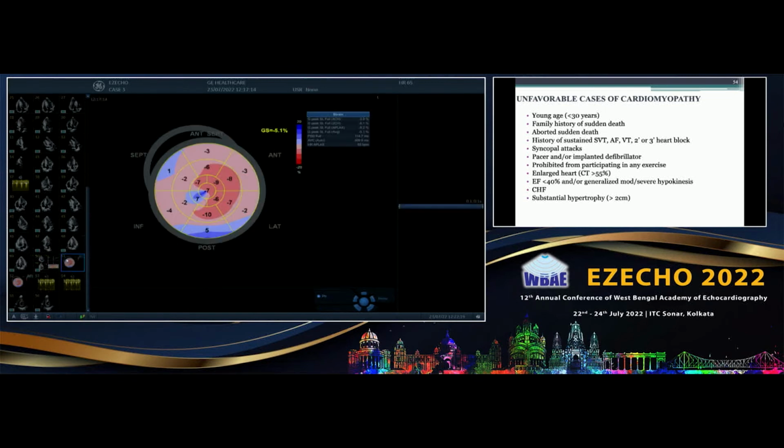Yeah. Now, you know that the septum was the most hypertrophied thing, and it has got some areas of blue, okay, and some areas of very low strain here. This can happen, that means this hypertrophy is pathological. This is because of the disarray. Some part of the septum is actually lengthening, because those areas are the interstitial fibrosis, replacement fibrosis, which are actually lengthening. So this is very important, and the hypertrophied areas show it.